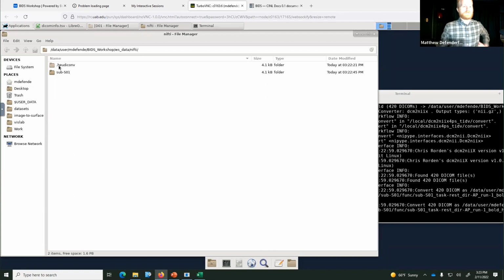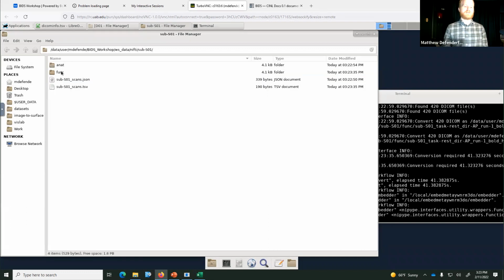Okay, so we're going to go ahead and add write permission. As soon as this is done running again, we're going to go ahead and add write permission to all of the files. I'll show you. It's a very simple command to do. I'll show you how to do that in a second.